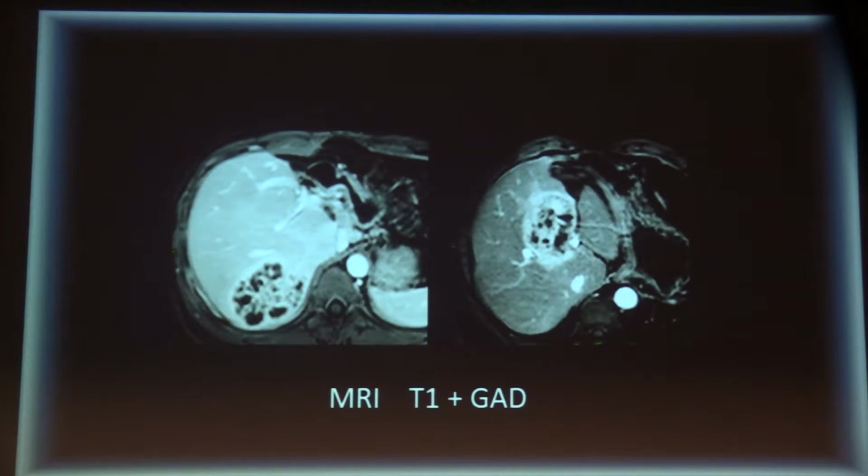However, look at these two images. These are two completely different patients. Both present with very similar solid or solid cystic lesions. They both are well circumscribed. They have solid enhancing components. They have cystic structures.